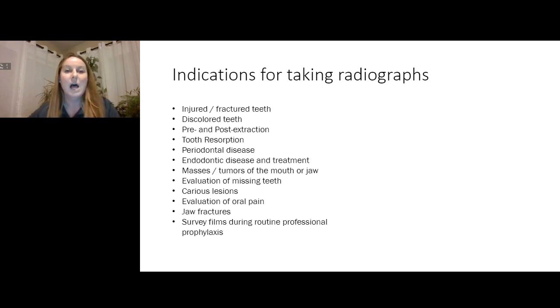But one of the reasons that we take those post-op rads, it's not just because the dentists like to tell you to take them. Fortunately or unfortunately, we live in a world that has a lot of law teams in it, and it's definitely recommended that you are able to back up the work that you're doing. And it's really important, especially in maybe some of your small dog friends that have those really big mandibular molar teeth, that after you've taken one out, you have the evidence to show that you did indeed not break that jaw.